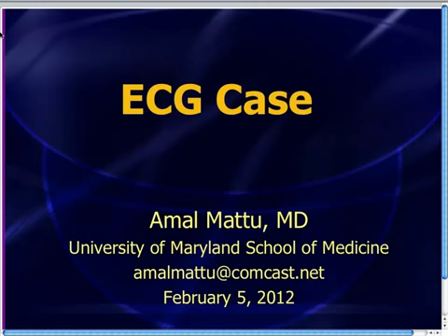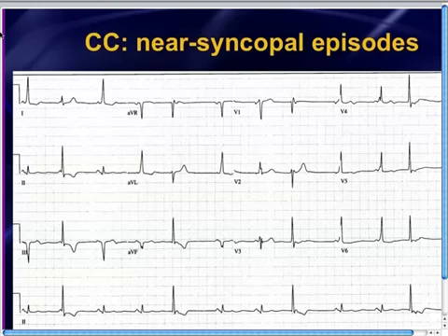It's a simple case. I'm only going to show you one EKG, but it was actually a case that had a lot of people confused. This is a gentleman that presented to the emergency department after having a few near syncopal episodes. He said he felt some palpitations, not really chest pain, just preceding these episodes. So, of course, you think about arrhythmia, and you've got to get your 12-lead EKG and hook him up to the monitor.